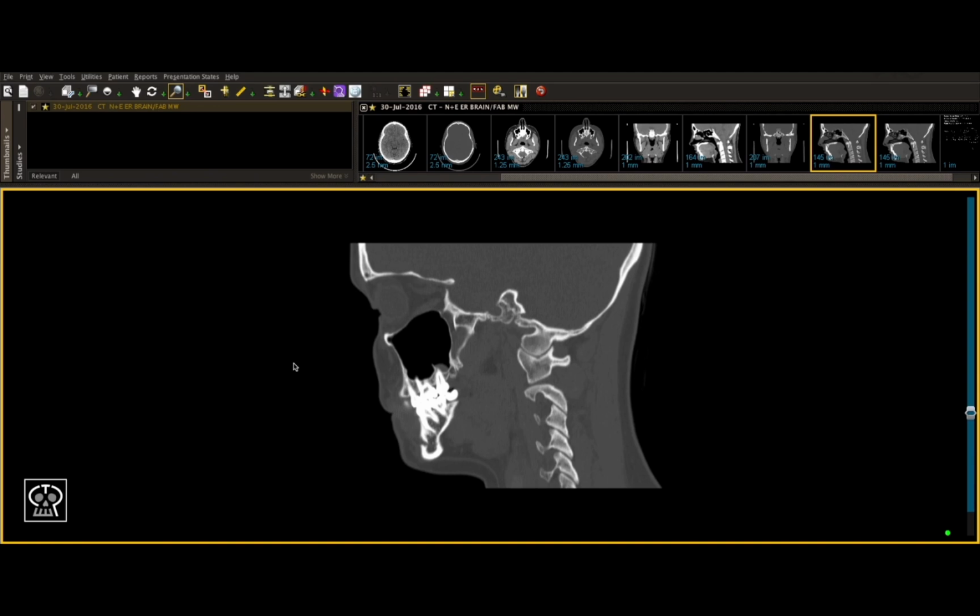Remember, fluid such as blood will always follow gravity and usually forms a straight line across the sinus of radiopaque material, whereas a mass or a cyst can form a dome-like structure and doesn't necessarily need to follow gravity. This is one helpful way of determining what you're looking at in the sinus.